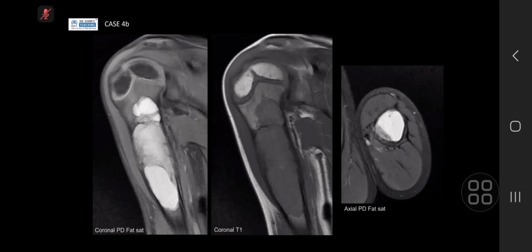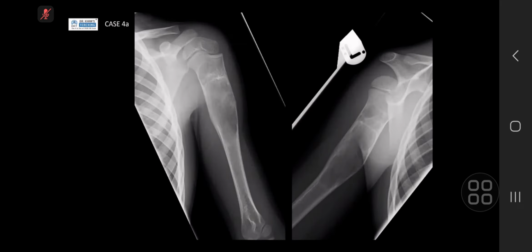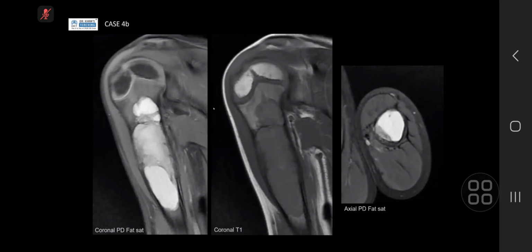Okay, good. So I think this is a tricky case. You tackled that really nicely. The key features are, I guess, it's intramedullary. The one that I've shown you has actually fractured before, which is why you're seeing that on the plain film. The lateral cortex fractured before within the proximal part of the lesion, and that's why I think it gives that kind of fibrous dysplasia appearance.